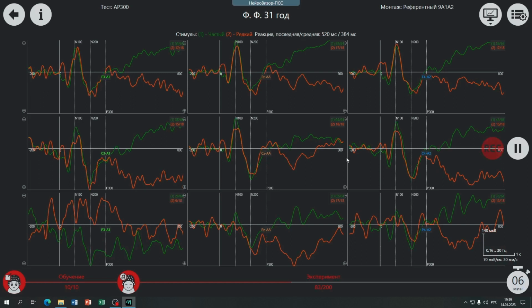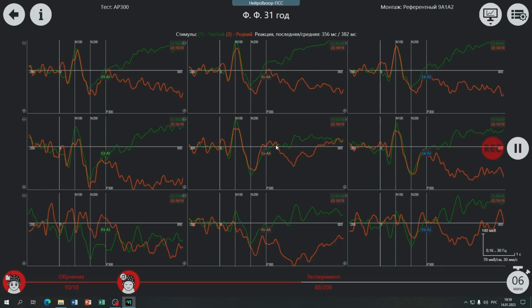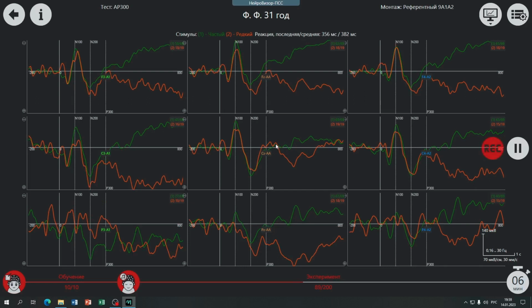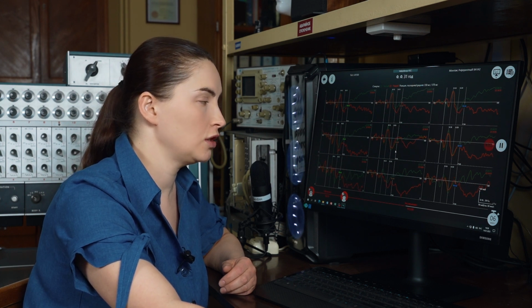After averaging 18 responses for the target stimulus, it is now crystal evident that, in contrast to the green curve representing the evoked response to the standard stimulus, a large positive deviation takes place considerably later than the sensory response that comes before it.